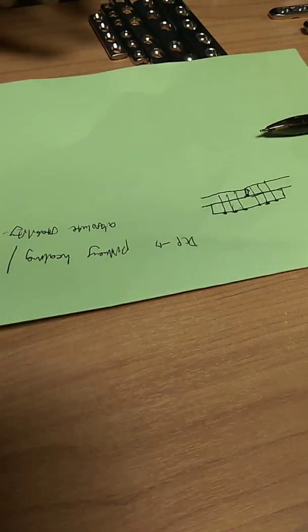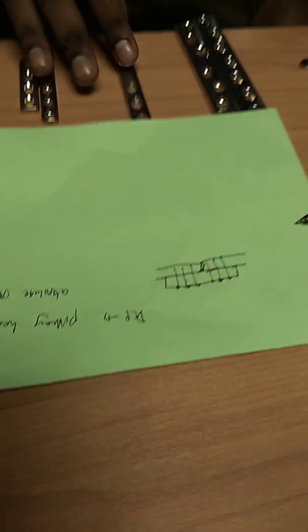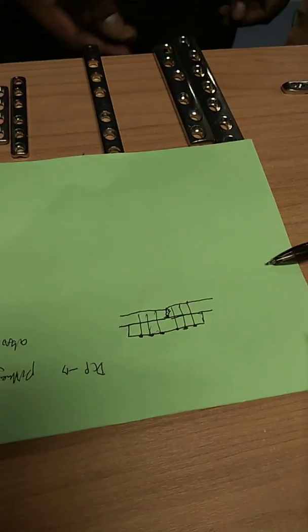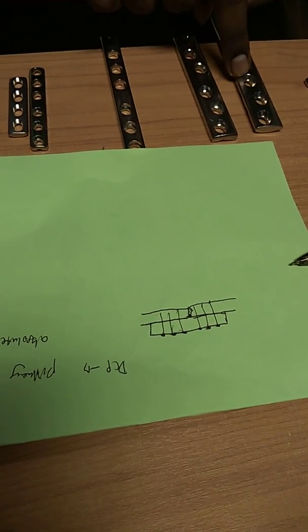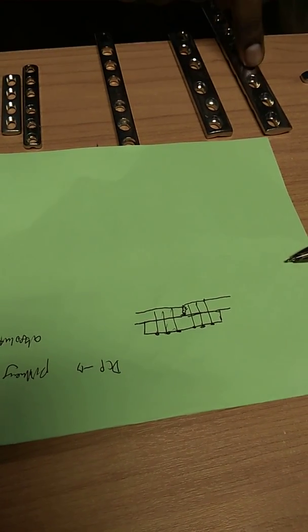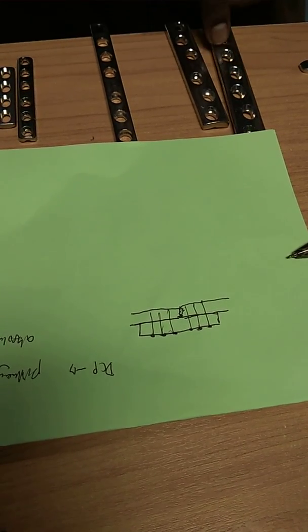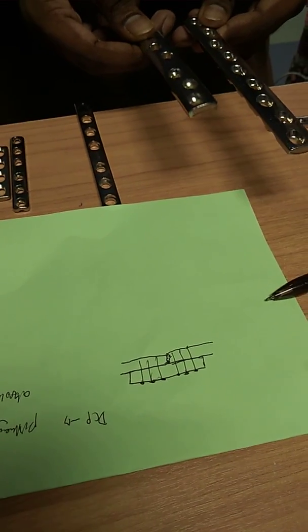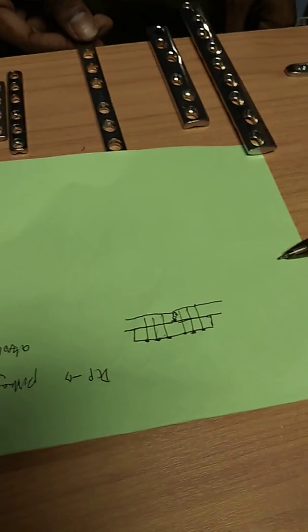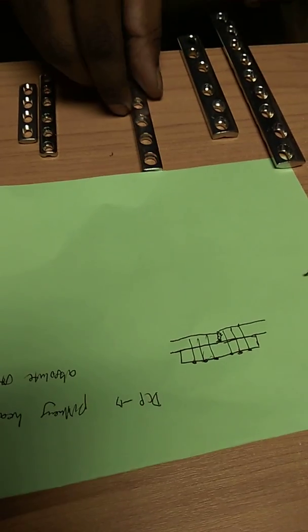Alright, now what is the difference between broad DCP and narrow DCP and small DCP? As you can see, to differentiate broad DCP from the rest, the holes are in a stepwise manner, like a footstep manner. Right, left, right, left, right, left, right, left. When you look at it, you'll know it's a broad DCP. Narrow DCP, everything is straight in a line. So a small DCP, right?